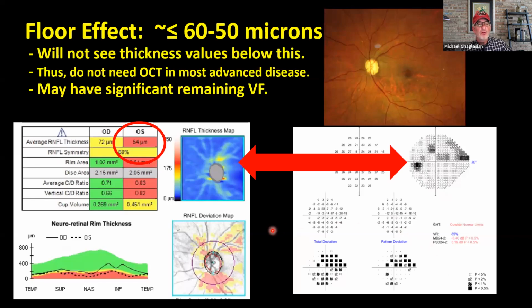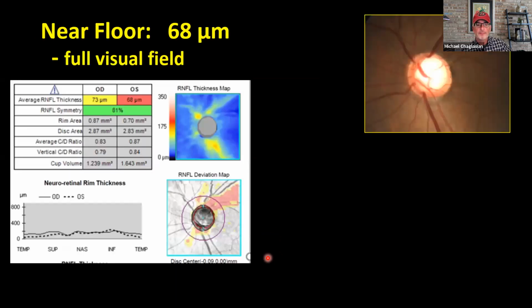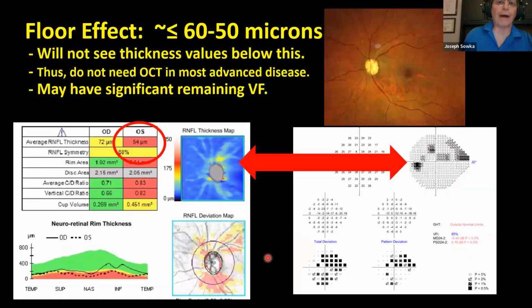And in this type of glaucoma patient, it's most likely to go quickly because they've burnt through, or used up, all of their retinal nerve fiber layer and retinal ganglion cell axons, and the disease may progress quickly. And interesting, Mike, that would actually be considered only a moderate glaucoma. That's right. This is where I sometimes disagree with that scale, Joe. Even though it tells me to say moderate, I'm going to put down severe.